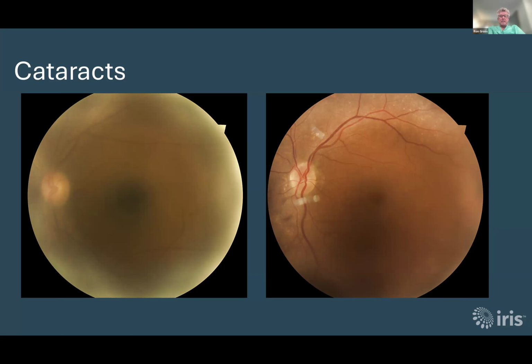But what it does is it makes our view the same view the patient has. So like you can see on the left, it's very blurry compared to the images that we've been seeing before. And that reflects that the patient is seeing that much blurriness too. There are other causes that can cause this blurriness. So we can't say definitively, yes, this is a cataract. There are other things that can cause blurriness to occur, but by far the most common thing is cataracts.